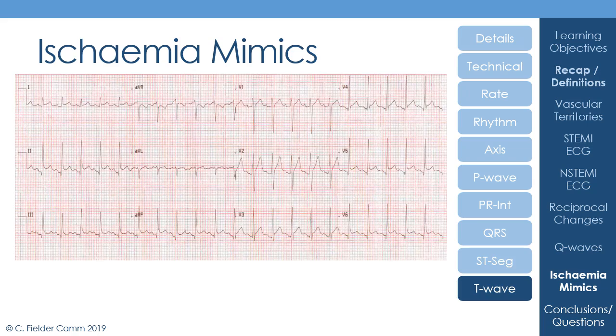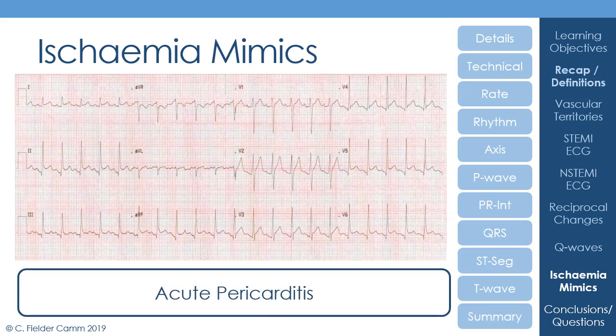So as we said, T waves appear to be upright, but appear to be pretty normal. So in summary, we've got a patient who's got a sinus tachycardia, going at 150 beats a minute, who has widespread ST segment elevation with some PR depression, and the ST segments appear to be saddle shaped. So I think this is most in keeping with acute pericarditis.